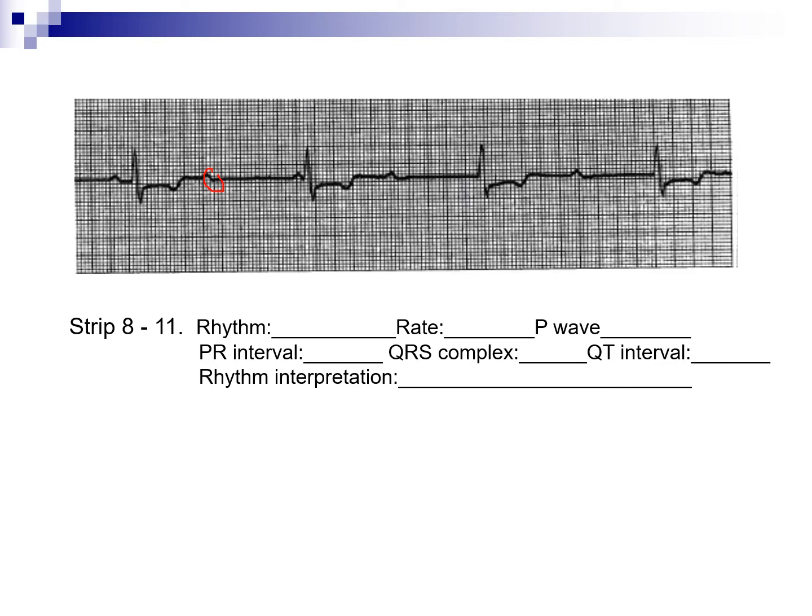The P waves are all over the place. If you look at them, some of them are probably hidden, but you can see many of them. So there's more P's than QRS's. There's probably a P wave hidden in this QRS if you mapped them. There are P waves, but that PR interval is not constant. It does vary, so there's no association between these P's and these QRS's.